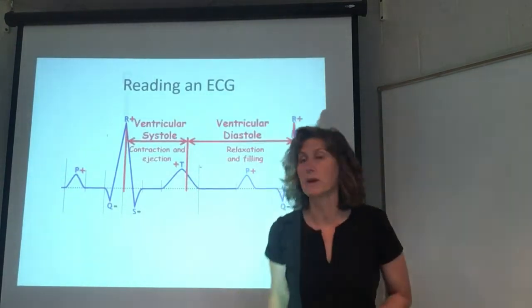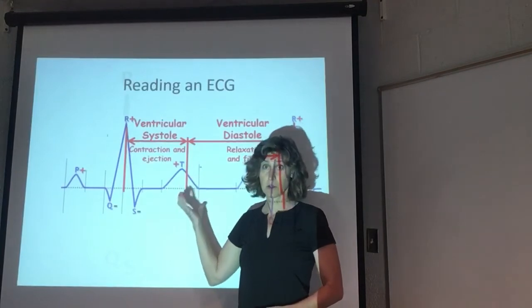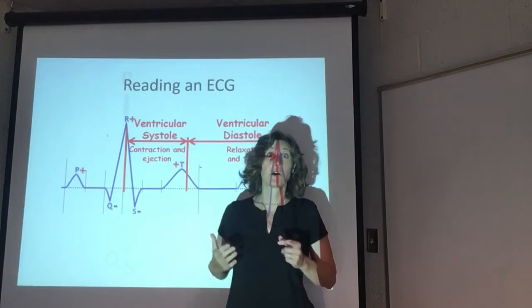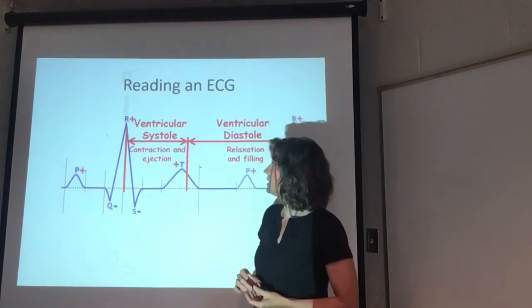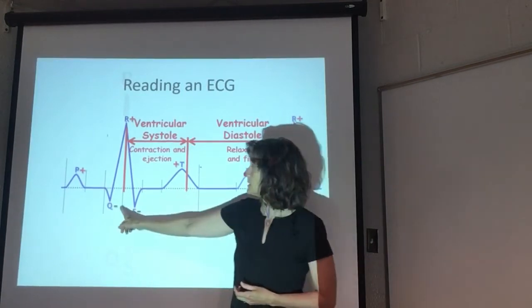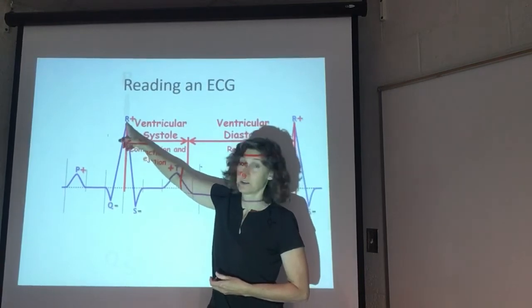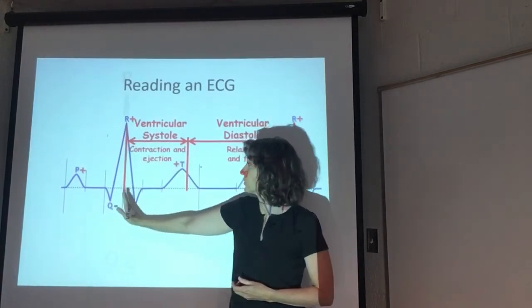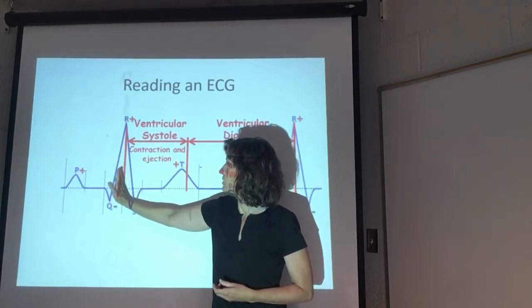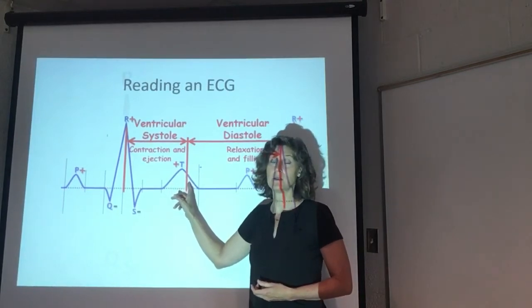Oh, one more thing about systole and diastole, because you're going to have to measure the length of time for systole and diastole in one of your heartbeats that you will have measured in this lab. So you need to be able to identify where systole begins and where it ends. Systole begins at the peak of the R spike, as this is often called. The very, very peak, right in the middle, you're going to find your point. This is going to be your I-beam cursor. Find it, start in the middle, and highlight to a third of the way down the T wave.